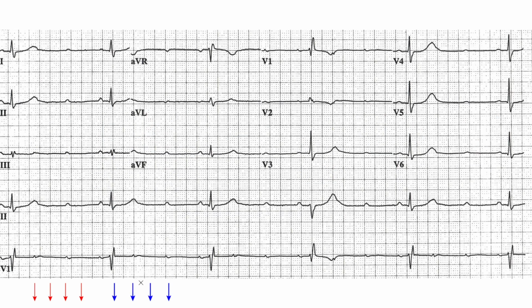So moving on to the 12 lead. Now I jumped a step where we show only a couple of leads, but that in between step typically has V1, lead 2, and V5. Here, immediately, do you see that? Look at that. Boom.